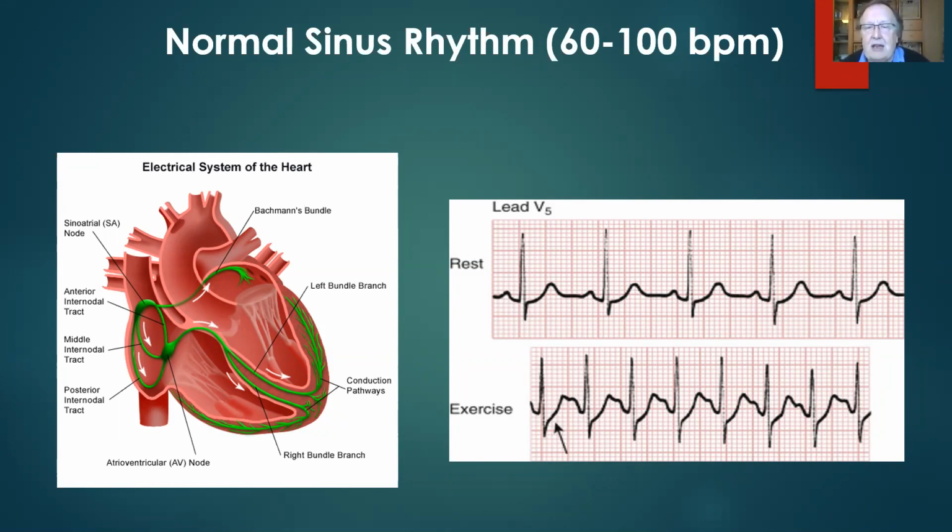But we can now see that the ST segment is depressed, and that's because the heart is not getting enough oxygen at the time. And it may be that this patient is suffering from angina on a stress machine. The T wave is the right way up. So we can happily say that normal sinus rhythm is occurring, but the patient has a depressed ST segment, and so we're going to do the rest of our checks. Next slide, please.